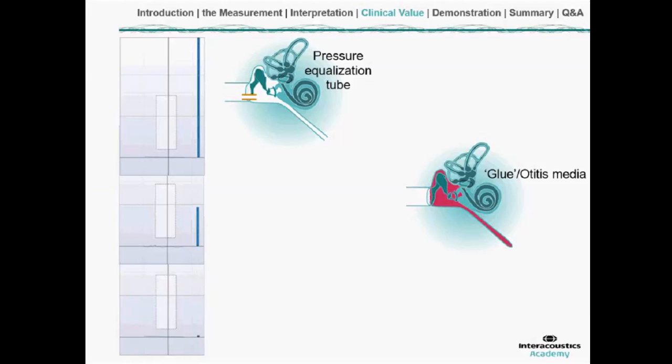So it's an indication of the ear canal volume as well as the air volume in the middle ear. In case an ENT doctor placed a pressure equalization tube, then this is a very healthy situation. Well, in case it is a perforation in the eardrum, then it's not such a healthy situation, and hopefully it was already noticed during otoscopy, which is of course always performed before tympanometry.